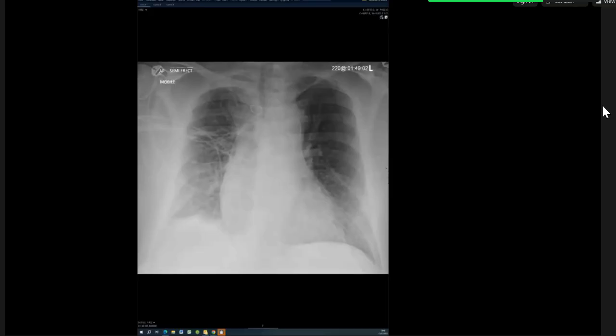This is a frontal radiograph of the chest of a patient who is in heart failure. I see that there's no pneumothorax, pneumomediastinum, or pneumoperitoneum. I see there are multiple external leads and midline sternotomy sutures. Then looking at the lung fields, there are prominent vascular markings. There is cardiomegaly, there is unfolded aorta. The bones are normal.